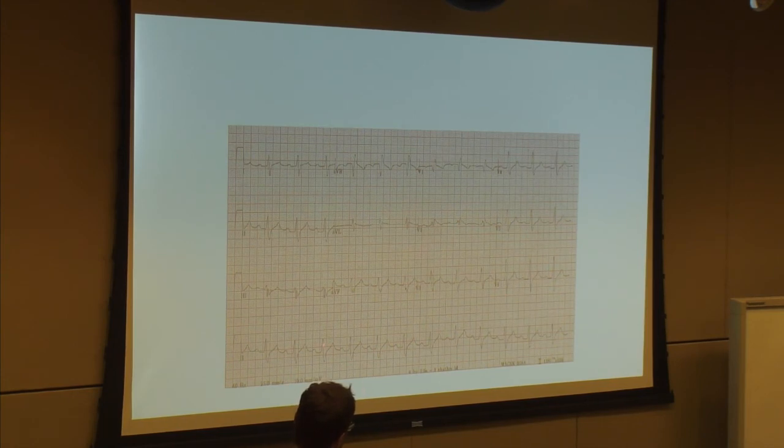My QT interval is a little outside of 2 big boxes, still probably within half the distance here, but I got a bizarre wide complex sinus rhythm, right? Doesn't fit classically into a left bundle, right bundle. And I got a prominent R wave here. So I got a number of cardiotoxic things going on here. You could argue that there's a fair amount of QT prolongation.